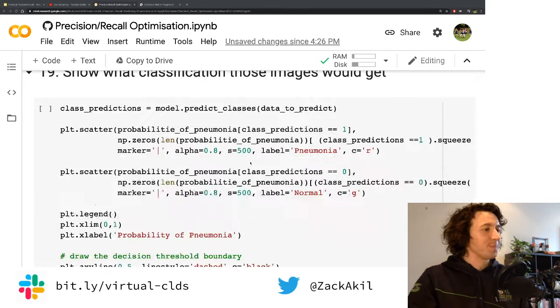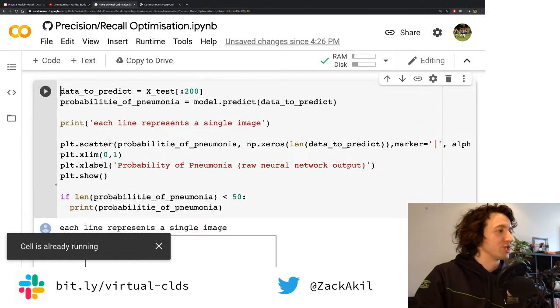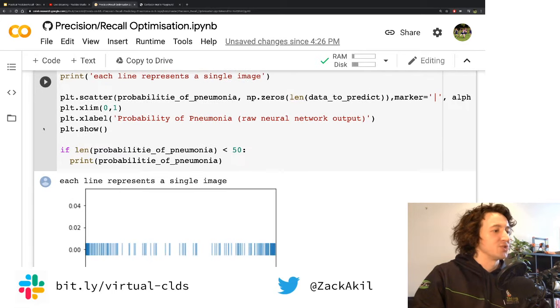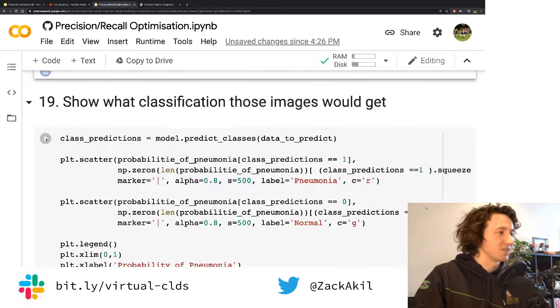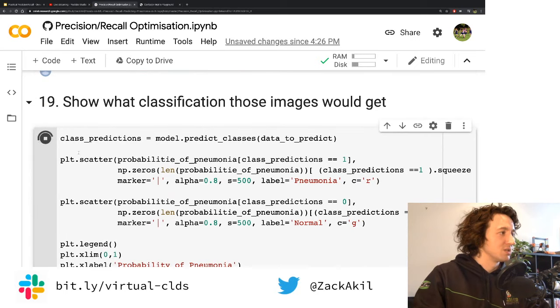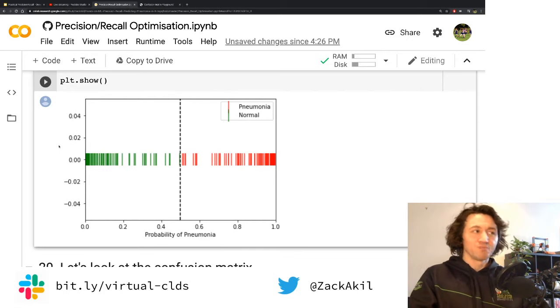Okay. Now we'll visualize. There's no need to input anything here. It's just running the code. Remember to hit the play button or shift enter. Let's show the classification. Run. Right. Go down here. Bam. So I didn't change anything.